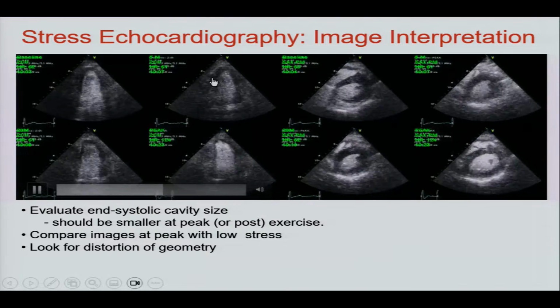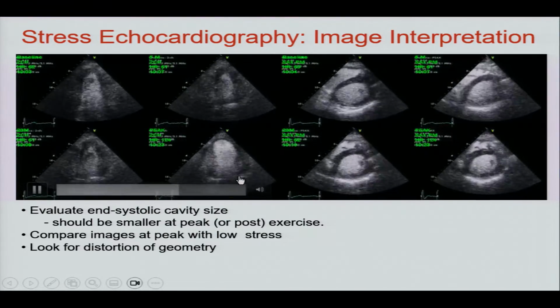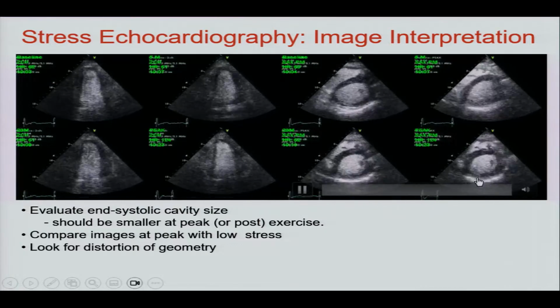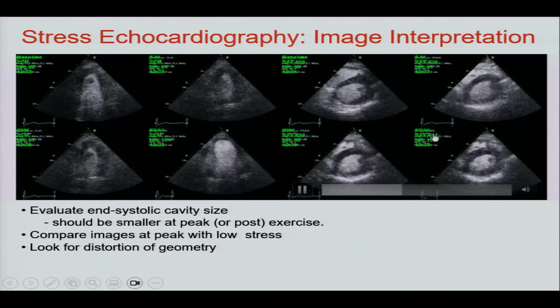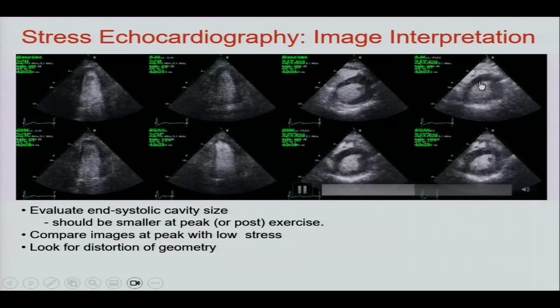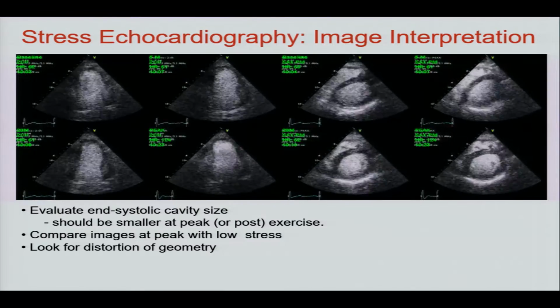This is clearly becoming accentuated, and then here you have dilation of the LV, regional but global, because the entire area, if you trace this end systolic area, it's going to be clearly bigger than that. And then short axis. Now, versus here. So this is an abnormal dobutamine stress echo. But what is it due to? We'll talk about that in a second.